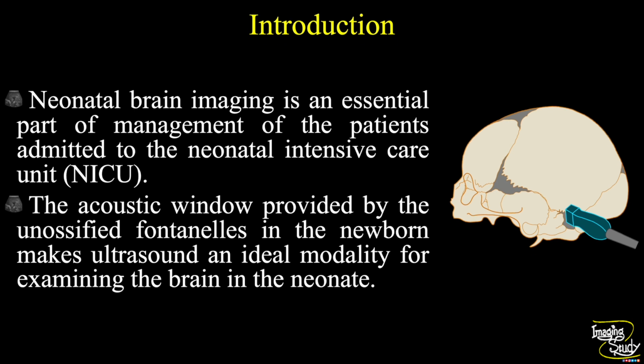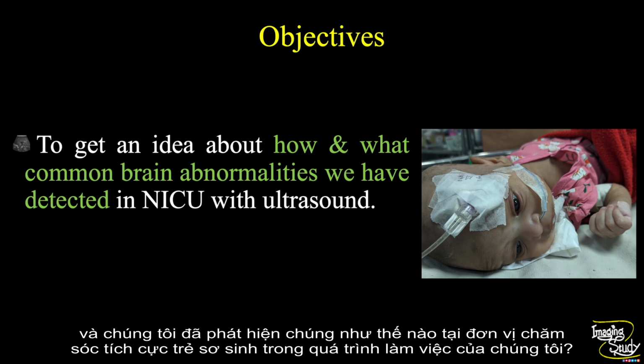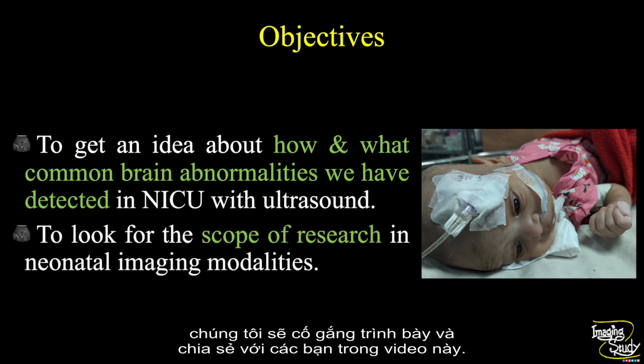Now, the objective of my session is to get an idea about how and what common brain abnormalities we have detected in the NICU during our practice. During our scans, we have found some problems and some questions, and to solve those questions, there comes the scope of research in this imaging field, which we'll try to cover in this video also.